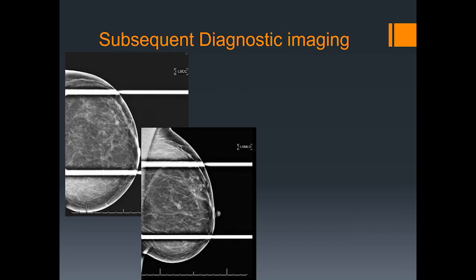The subsequent diagnostic imaging was chosen as spot compression views, demonstrated in this case in 2 views of 2D digital mammography. 3D imaging may have been obtained. In this case, 2D imaging is shown both in the CC and orthogonal views. As you see, the focal asymmetry presents and persists in this generally low-density scattered breast. Your next decision is how further workup might be obtained, thinking about correlation as we go.